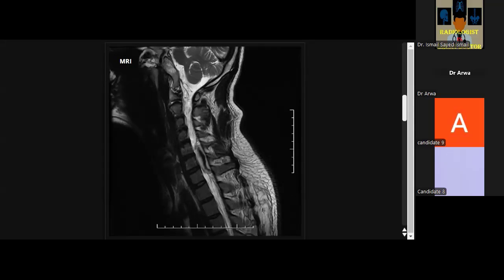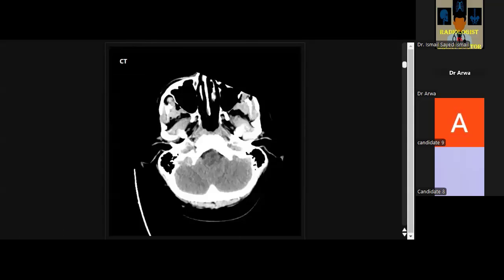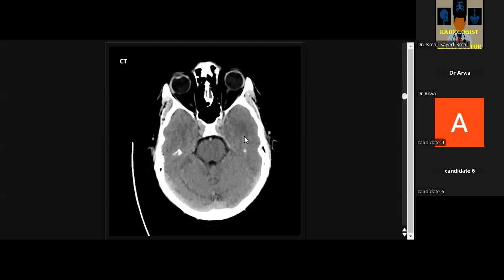Okay, boss, very good. Now another group of questions in CT brain. The first candidate in this group, you can ask for control. Yes, sir. Okay. The last is extradural, yes. Extradural, maybe blood, maybe abscess. I accepted, just a minute. I accepted. You can scroll. Okay, good. Headache.